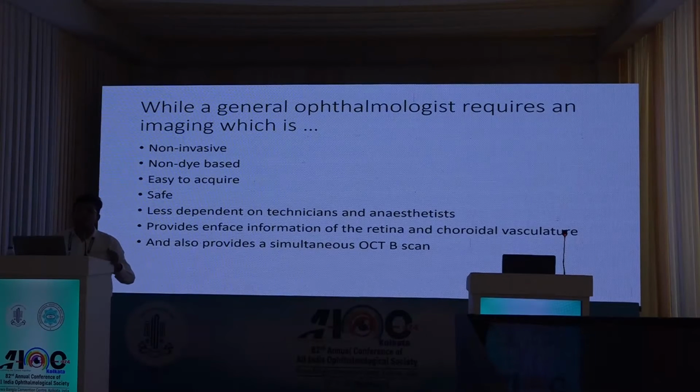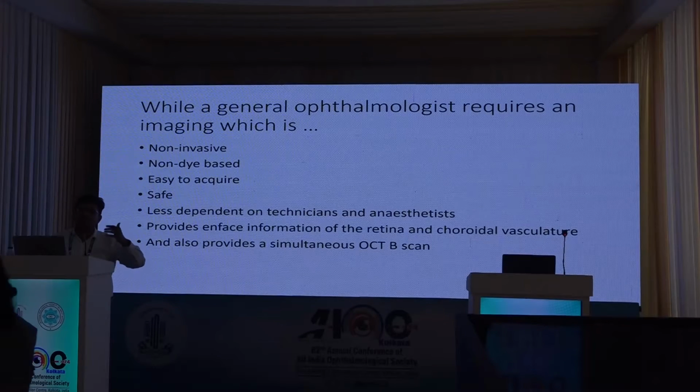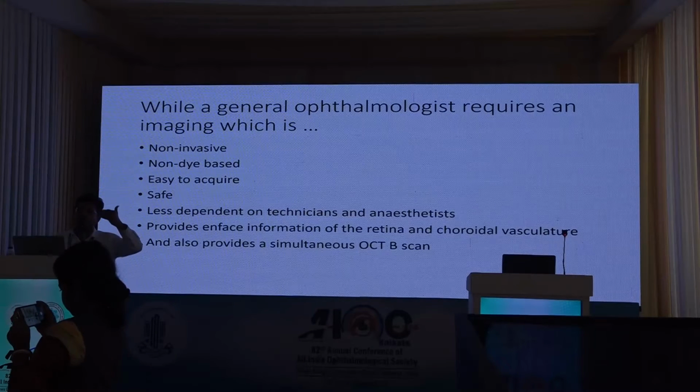And this one-stop solution is what you require, where you have the OCT B-scan and you have the en face imaging of the OCT, where there is segmentation happening at the different layers.